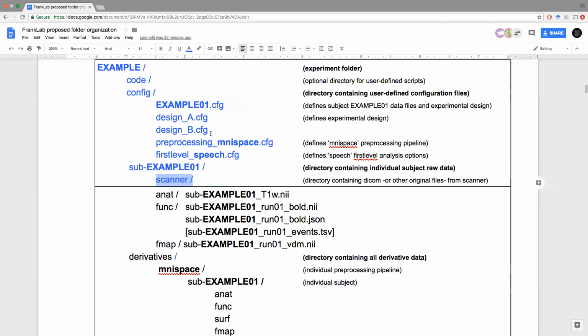So I don't know which one of these to recommend and which one is going to be cleaner. In practical terms, all that the pipeline needs is for you to specify where your T1 file is. It doesn't matter where that file is actually located. So that gives us a little bit of flexibility as to what to recommend. Should we recommend people to copy them within these folders, or should we recommend them to have them in a different folder where they actually have been run?